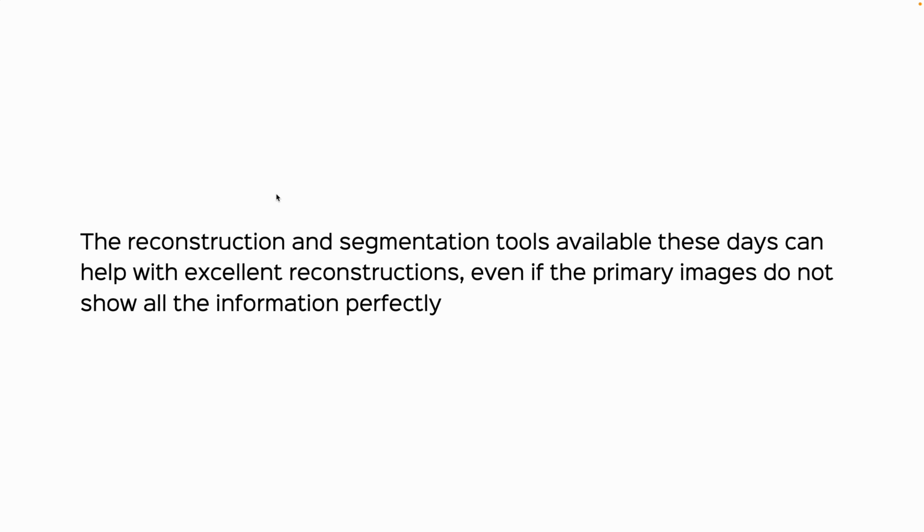So the answer, obviously, this is a case of intra-lobar sequestration, but the whole idea was that the reconstruction and segmentation tools, especially things like TotalSegmentator, have completely revolutionized the way that we can reconstruct and segment things. And these don't take much time.